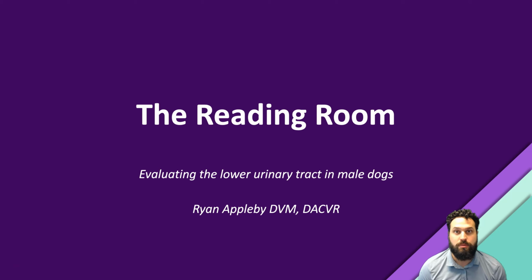Radiographs are a hugely important part of our diagnostic tool set in those cases, and knowing what to look for and how to position our patients becomes a really valuable skill set. So let's dive into the case.